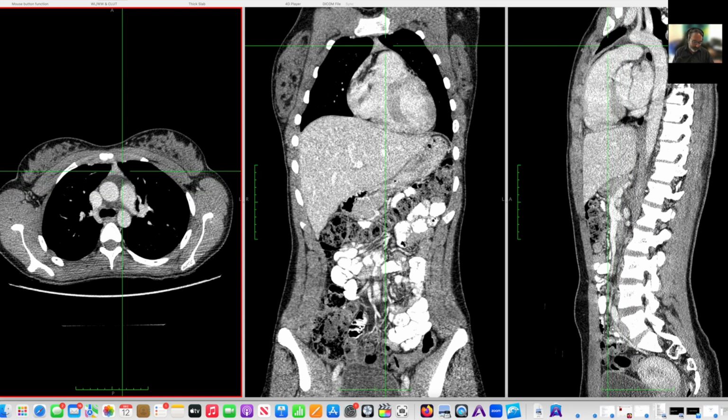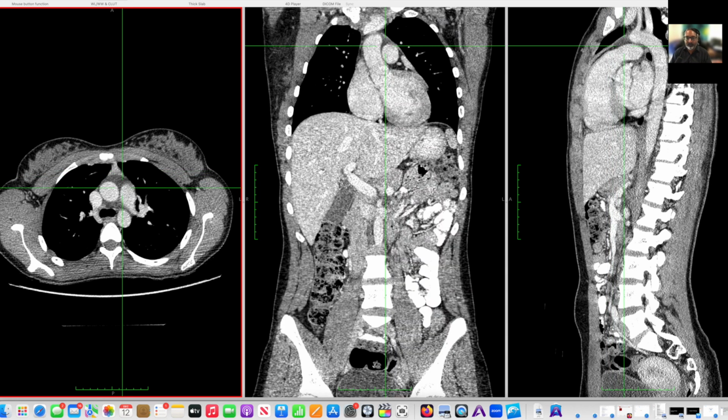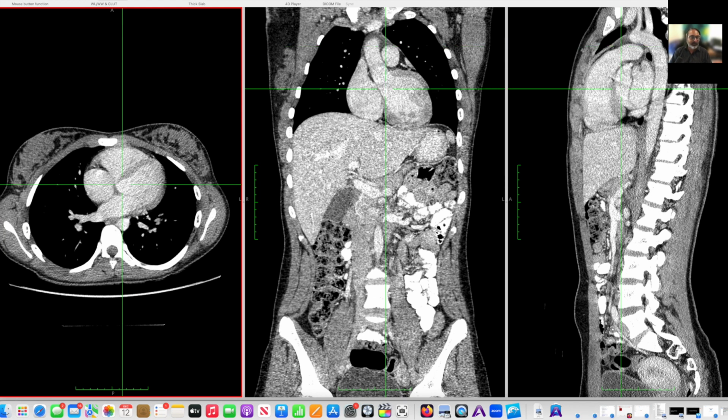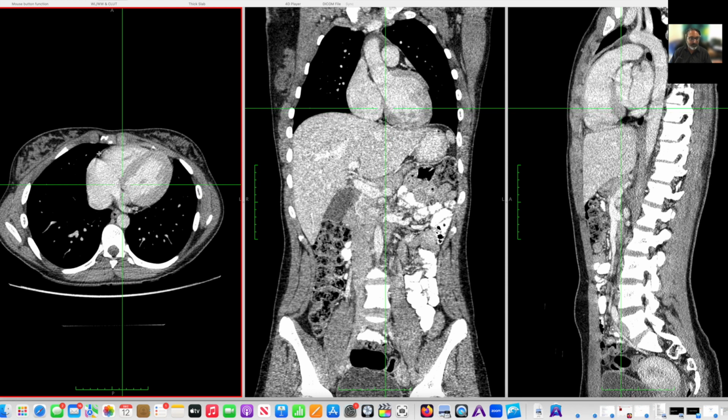I don't talk enough of the pericardium. You can see here very well that's all the heart, but there's a layer around it, and that's the pericardium. The pericardium sits on the diaphragm. The diaphragm has a tendon in the middle, and the fibrous tissue of the tendon is continuous with the pericardium. You can see that layer around the heart; in some places you can't see it, but that's the pericardium.